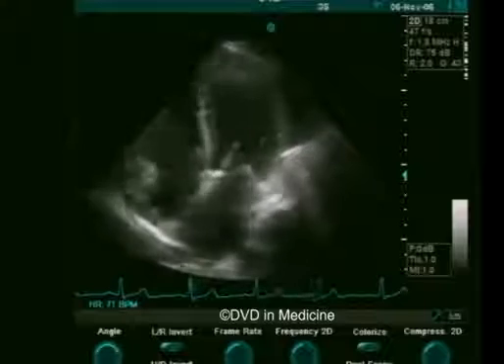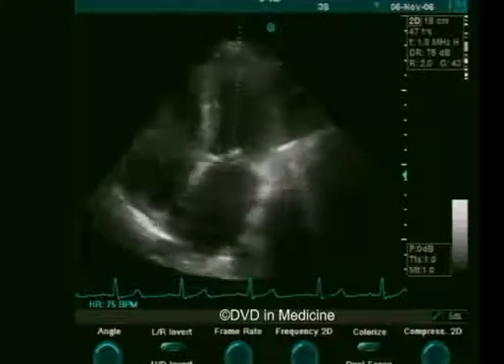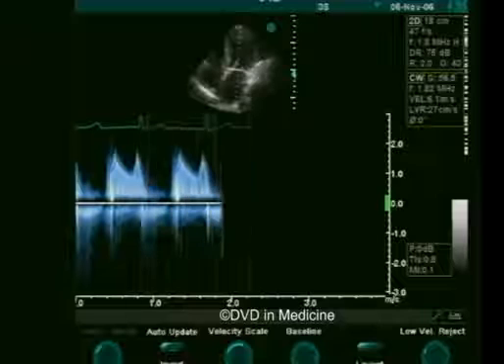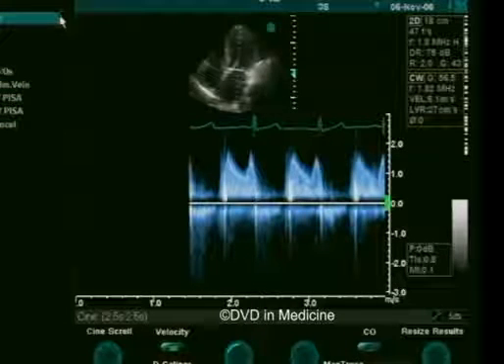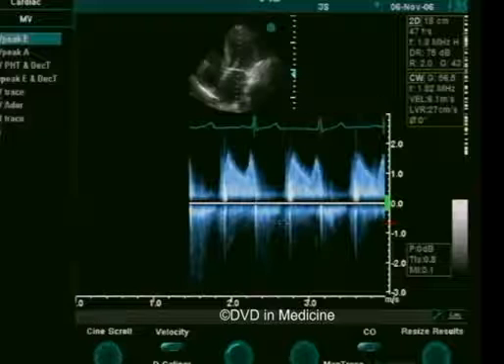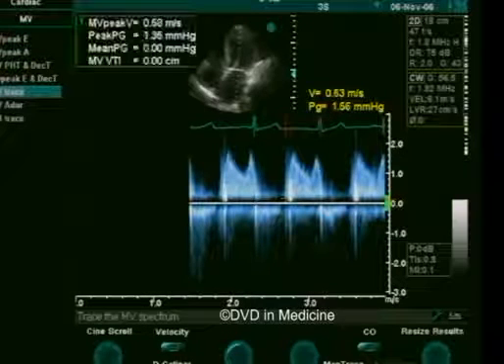If there is a mitral stenosis present, one should use continuous wave Doppler for quantitative calculations. This method will allow one to measure the area of the mitral orifice and to determine the mean pressure gradient across the mitral valve.